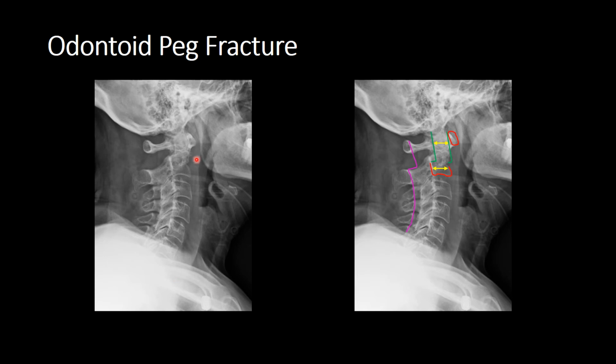So it's the equivalent of a third of the vertebral body at C2, and the equivalent of 100% of the vertebral body width at C7. If we look, there is soft tissue swelling here. There is bulging of the soft tissue line. This is bigger than normal. This is abnormal. So we've got a positive soft tissue sign.